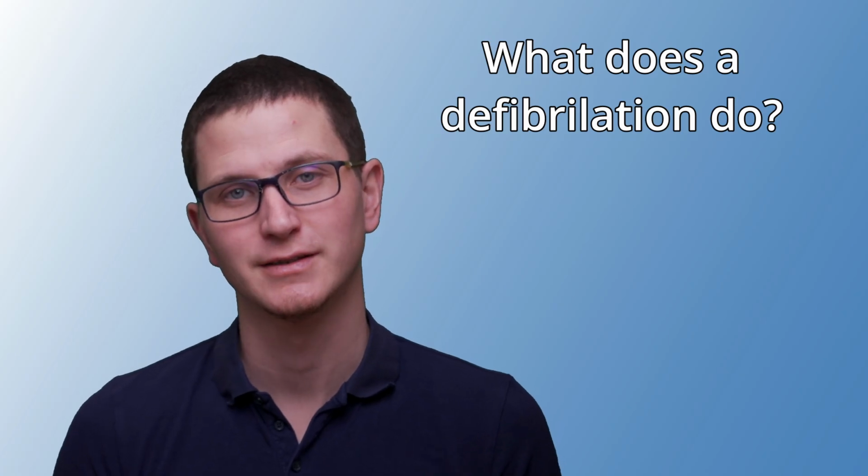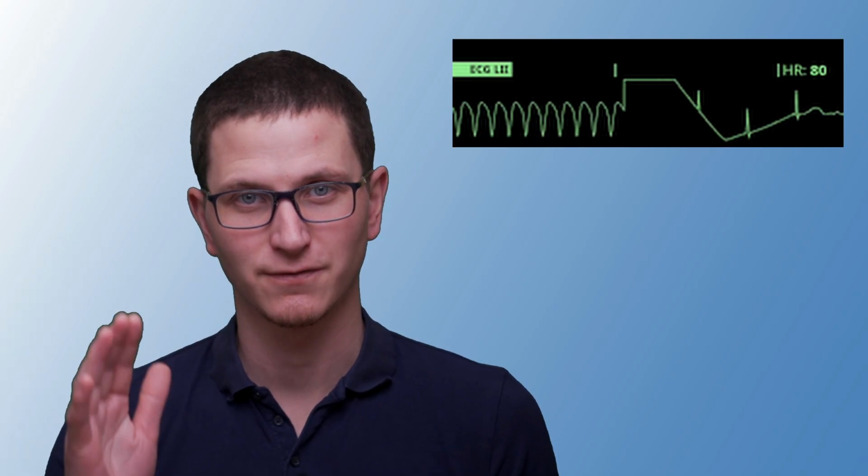So defibrillation doesn't restart the heart. Defibrillation stops the heart, right? It's kind of like you take your hand and you smack the rhythm flat. That's exactly what we're doing. That's what defib does, right? It just flattens the rhythm, hopefully into an asystole, so that then the SA node, the sino-atrial node, can take over. Why would we want to defibrillate? So let's go to our shockable rhythms.